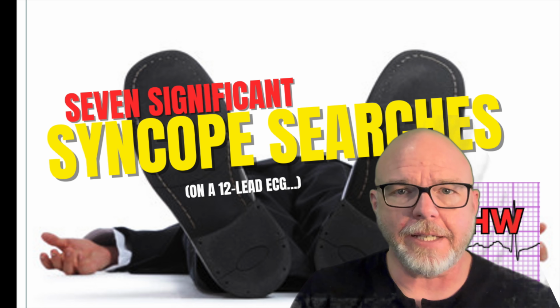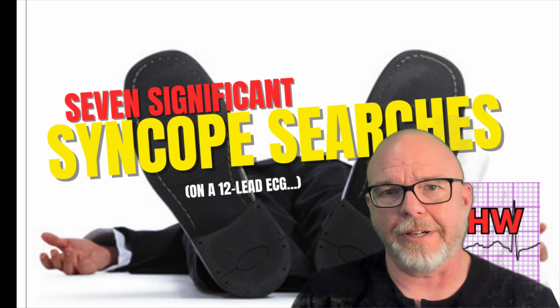I love this picture. Let's talk about syncope a little bit. Specifically, I want to talk about 7 significant syncope searches on an EKG.